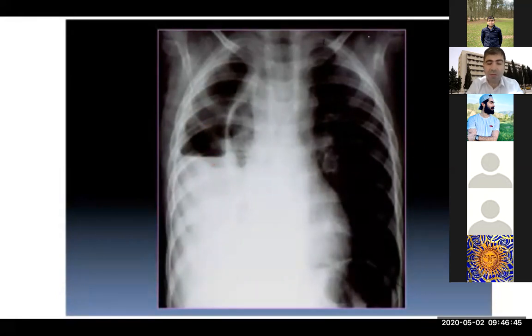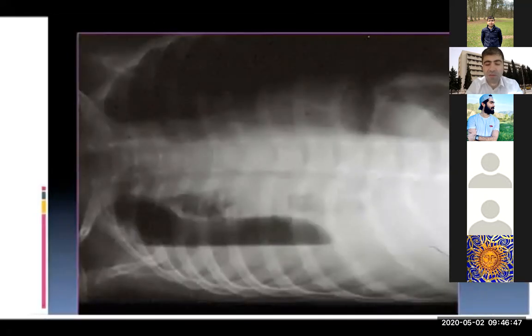So if we do the decubitus for this patient, so this is the decubitus. There is still fluid here, right?